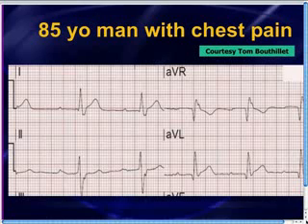But the other thing that hopefully by now has caught your eye, if you've been following along in this EKG series, is the morphology of the T waves. Notice how straight the initial part of those T waves is. Normally we want to see T waves that are nice and concave upwards. Sometimes people refer to that as a smiley face.